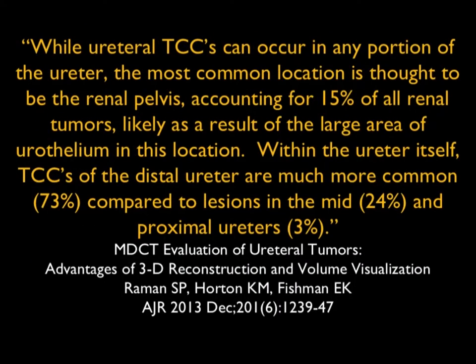When you speak about transitional cell carcinoma, the most common location is thought to be the renal pelvis. Within the ureter itself, TCCs of the distal ureter are much more common compared to mid and proximal ureter. So distally is indeed most common.